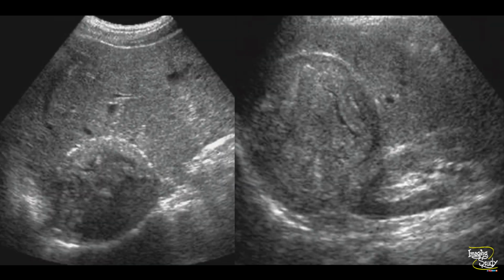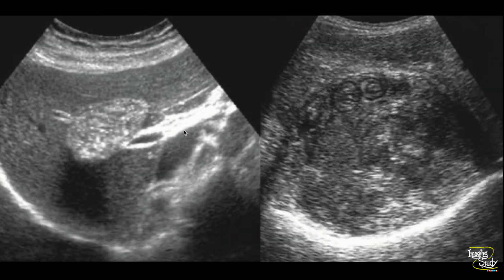Here is a solidified mass with marginal calcifications indicating the inactive stage of hydatid disease. On the right image, there are finger-like projections within, which highly suggests hydatid disease. Here is a central liver mass with rim and internal punctate calcification. On the right, you can see the complex mass with multiple ring-like structures suggesting hydatid disease. During surgical resection, the cystic mass showed thick debris and innumerable scoleces.